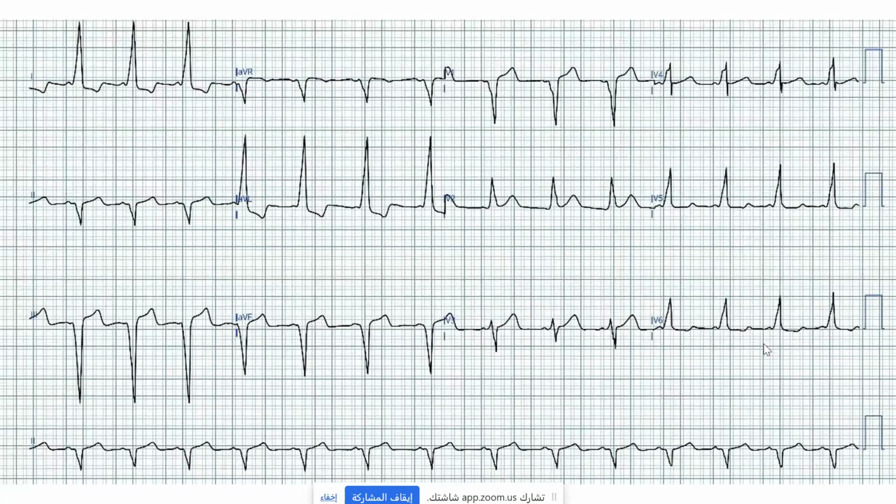By the way, this patient was cardioverted, and this is his ECG during sinus rhythm. What do you think, Namarek? A wide complex, some width of the QRS complex. So it's a wide-ish QRS complex, a rate of about 70, 65, like this. What else?